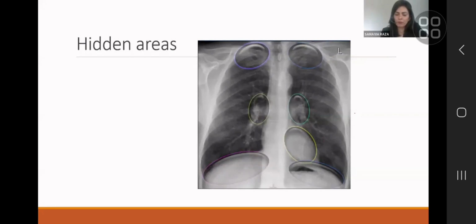In very nicely projected, good quality radiographs, the pulmonary arteries can look very prominent, and very commonly these are reported as bilateral hilar lymphadenopathy, or my favorite, cannot be ruled out. Well, of course it can't, nothing can be ruled out, but the lumpiness or the lobulated contours of the pulmonary artery can look like lymphadenopathy to a junior radiologist. So when you think there is lymphadenopathy, think to yourself, can I describe it away?